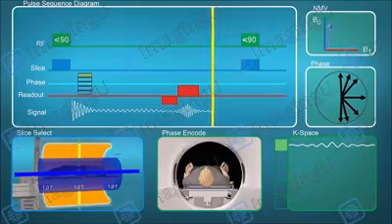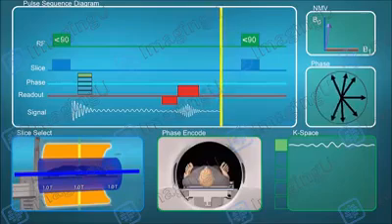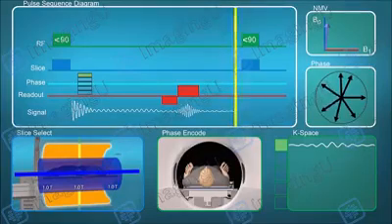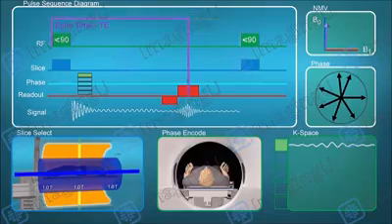You can think of a pulse sequence as the pulse sequence recipe. As the operator, you are able to change aspects of the pulse sequence by entering certain parameters at the console. Repetition time, or TR, and echo time, TE, are just two examples of these parameters, and we will cover them as well within the pulse sequence animations.